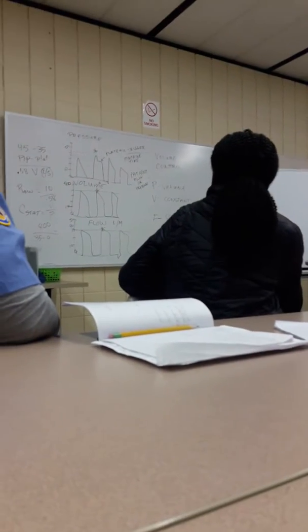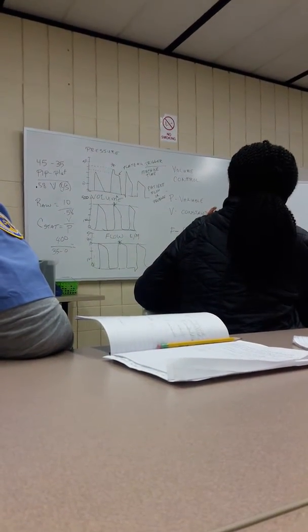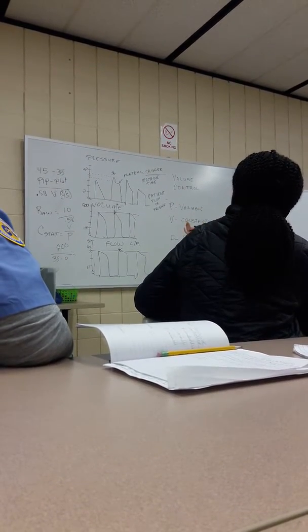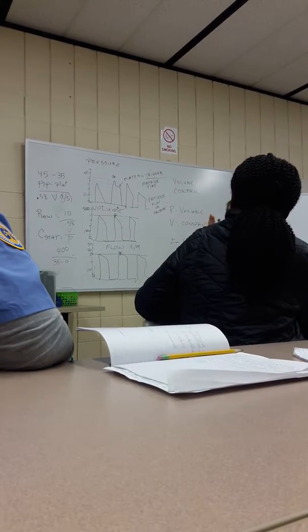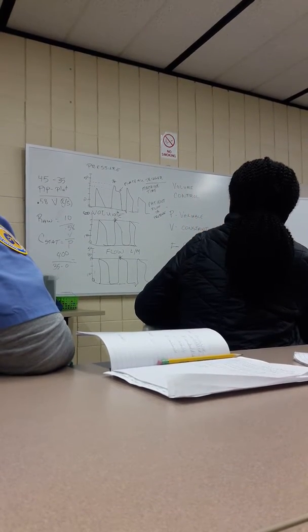Now, if the ventilator gives a breath, because if I have a respiratory rate of 20, there should be a breath every 3 seconds. And if that patient hasn't triggered a breath within that 3-second time frame, the ventilator is going to give the breath, therefore it was time triggered by the ventilator. But if 2.3 seconds in, the patient says, I need a breath, the patient took the breath, you'll see a deflection, either in the pressure or the flow. And that would be the patient's triggered breath, okay?